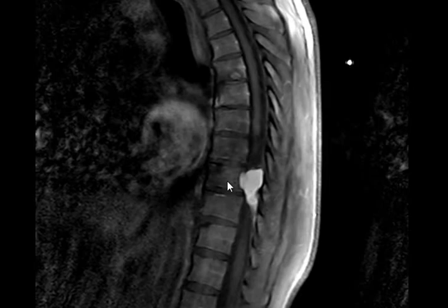Hemangioma is asymptomatic. This is just accidental. We need to distinguish this. This is different from the other one. The meningioma, it's the one that is causing the symptom. It's causing compression of the spinal cord. It's causing the neurological presentation of the patient. Meningioma is enhancing or not enhancing? Enhancing. Homogeneous, vivid, light bulb, intense enhancement.